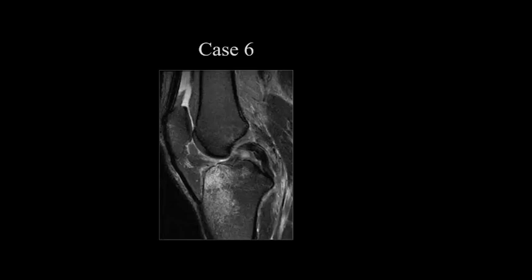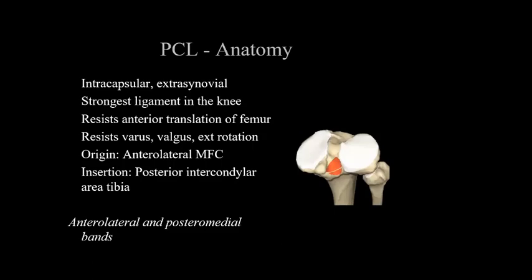Okay, all right. So we move on now to the PCL. Like you said, you are absolutely correct. There was a PCL tear at the femoral attachment. So move on now to the PCL. Sorry, I don't know how to move this one.